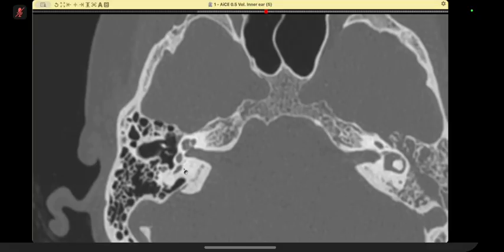In this particular case, it was scarred. But the key thing as far as radiology is concerned, you remember the signal. On pre-contrast it was not high signal. It was intermediate signal, and then it enhanced like anything. The key thing was the coronal post-contrast, contrast-enhanced image, where the enhancement was extending into the adjacent meninges. So it was a meningioma, and it was not a glomus tympanicum.